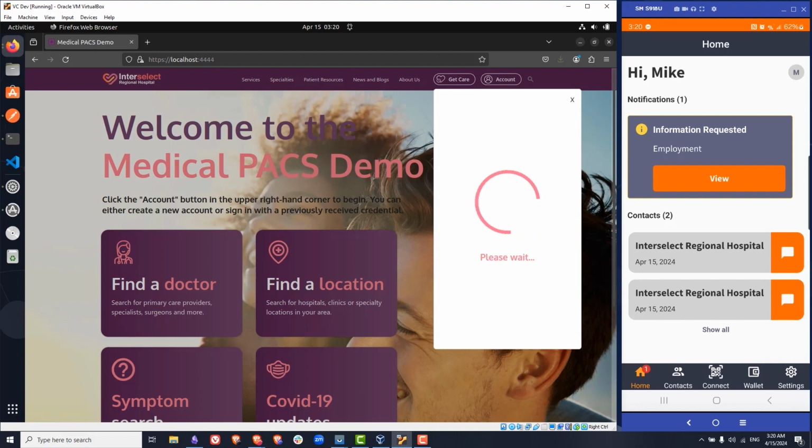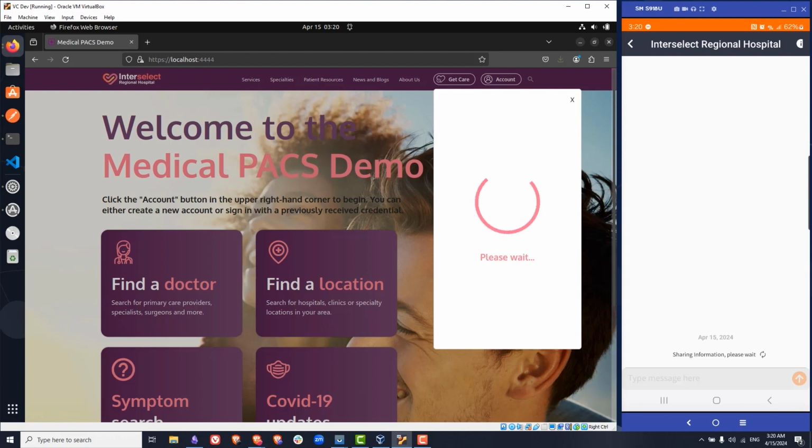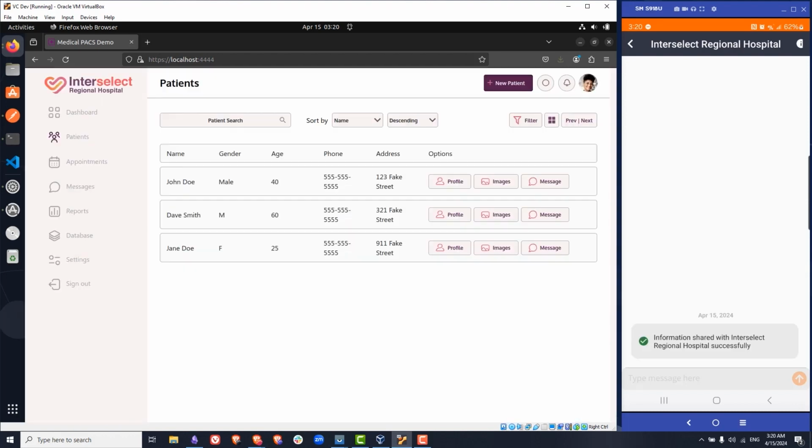When the portal asks us for our credential, there are two different basic kinds of checks that we've programmed in here. The first one that we're doing now is we'll share our credential, and it's looking at our attributes and then sending those to Amazon Verified Permissions for some policies that say, are we allowed to access the system? Just to see that it exists and get in and look at this portal here.